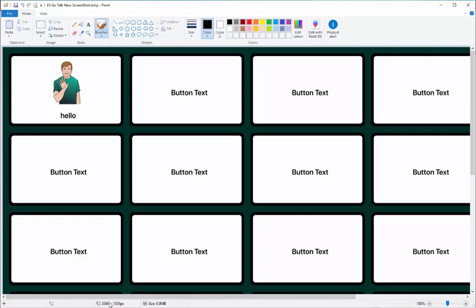And what you'll see down here, if you follow the mouse, is a region that shows how big the screenshot is. On an iPad 2, it's 2048 pixels wide and 1,536 pixels high. The other thing you need is to make sure you have a screenshot that is all of the pixels. Just remember that, and don't do anything that would shrink the image, like embedding it in an email message.